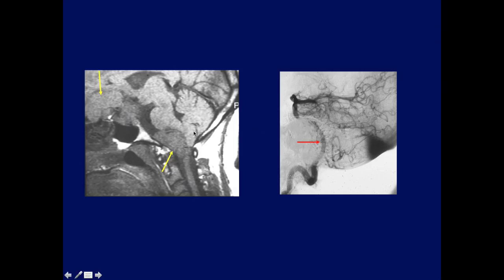And I just wanted to show this lower clival meningioma, now in the region of the foramen magnum, and again, from the old days, this classic backward bowing of the vertebrobasilar system, again, not the hooper one like on the prior case I showed. This one looks normal, but this is lower. It's not the same patient, but this also was an indication that we were dealing with a pre-brainstem or medulla lesion causing this classic angiographic deformity.